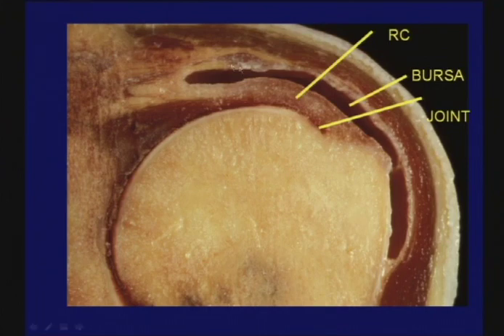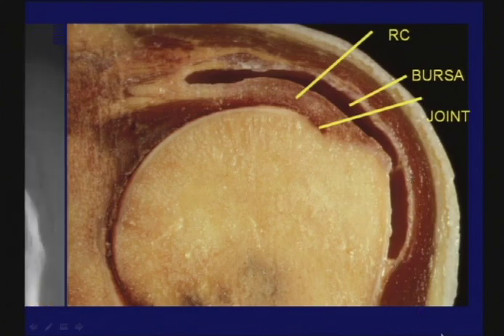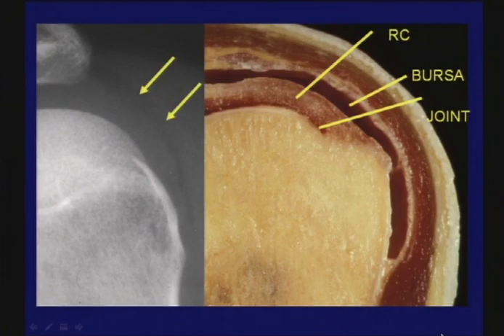A partial thickness, bursal-sided tear of the supraspinatus tendon may be invisible to the arthrographer. Surrounding the bursa is a radiologist's friend, the peribursal fat plane, and you can kind of appreciate it on this image. This is a friend because you can see it with many imaging methods, including conventional radiography done with internal rotation of the shoulder. So this is what the normal looks like.